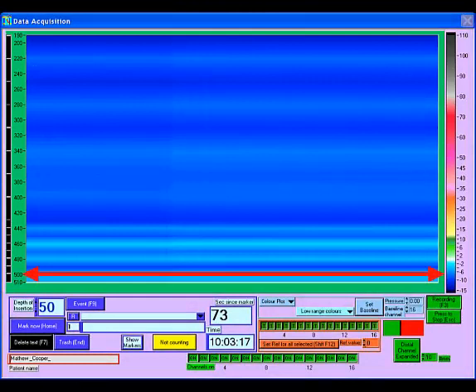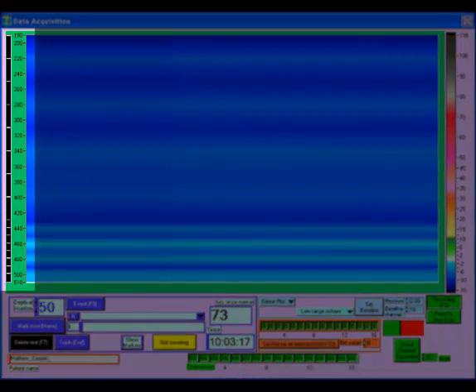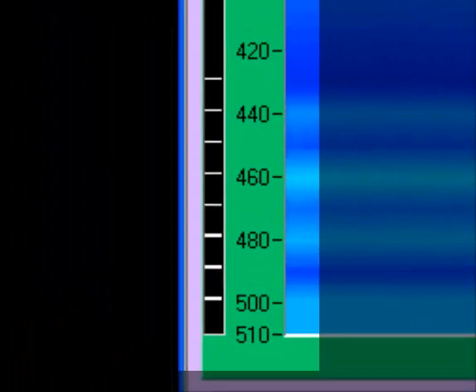The x-axis represents time and the y-axis represents the position along the catheter, with the actual sites of the recording points indicated in the vertical black bar on the left of the graph. You can see that the catheter has a high resolution zone at its lower end, where the channels are spaced at 1 cm intervals. This is intended to be placed across the lower esophageal sphincter. Above this, channels are spaced at 3 cm and are intended to record from the body of the esophagus.